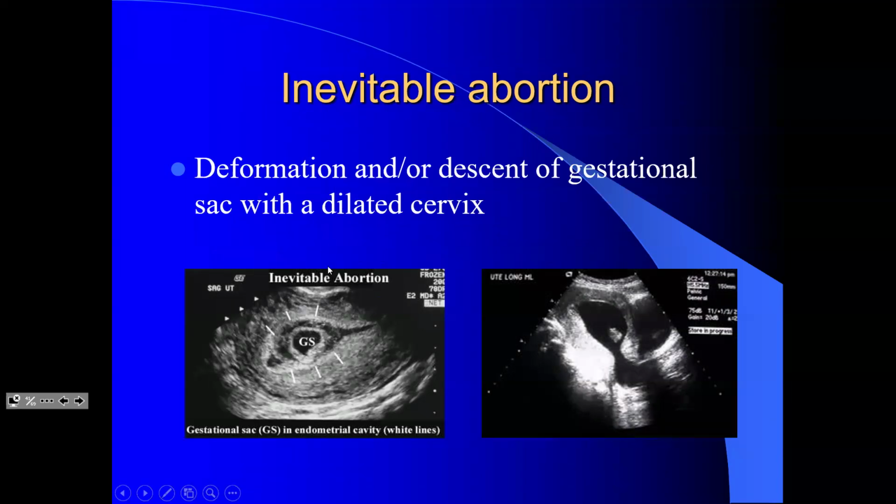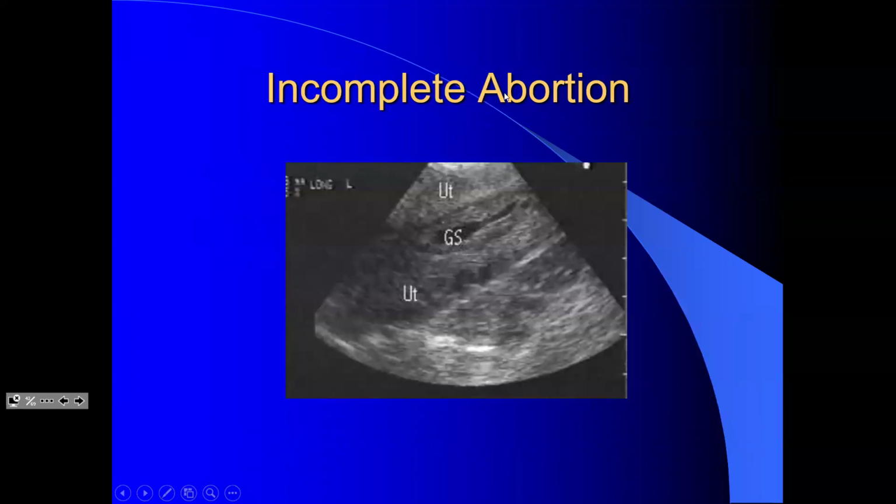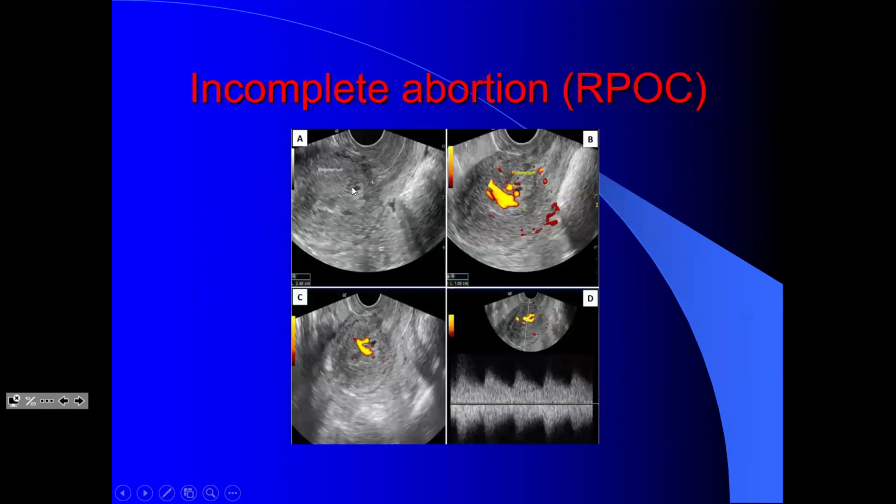It's a type of abruption where you have blood between the uterine wall and the gestational sac. So inevitable abortion means this sac is not going to develop normally, and this is where the cervix has opened up. The fetus is still there, but it is sooner or later going to come out. This is incomplete abortion, where you see an irregular or granulated, linear shaped sac inside the uterine cavity, another sac inside. And if the sacs remain small in size and you've done an ultrasound earlier which tells you it should have been this by this time, then again it tells you the growth has stopped.